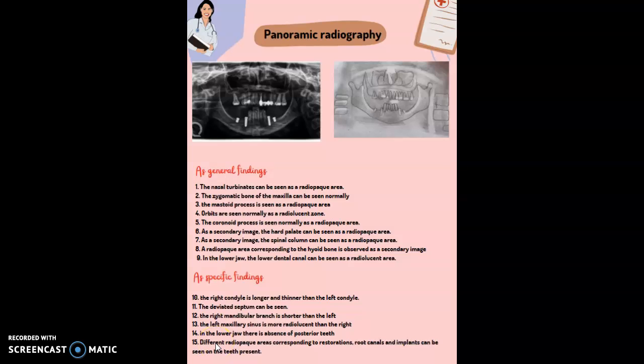Good morning. This is the panoramic X-ray I chose. General and specific findings can be found on panoramic radiographs. As general findings: 1. The nasal turbinates can be seen as a radiopaque area.